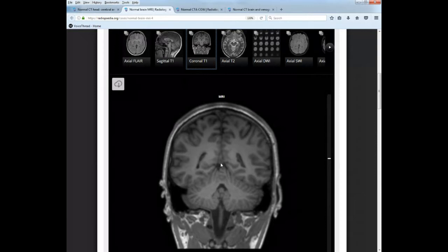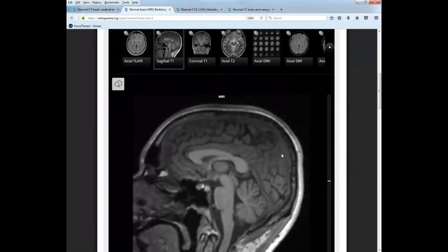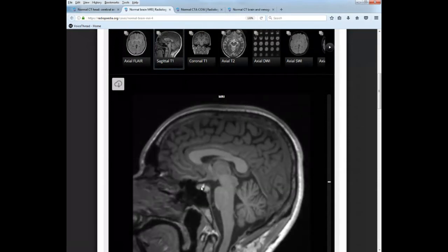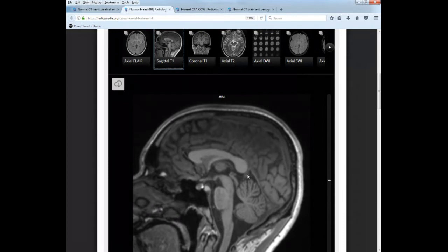So now we're moving on to the limbic system, which is really tied into all of this. The limbic system, let's switch back over to the sagittal. So here's your pituitary. We already talked about the pineal gland right there. Hippocampus, don't worry about that.